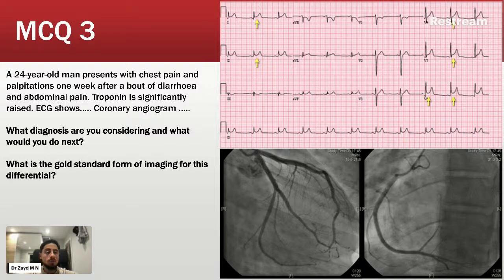However, having a look at the angiogram just here, you can see that it's largely normal. There's not much evidence of any constriction in the vessels. No signs of any STEMI or any sort of cardiac signs, really.